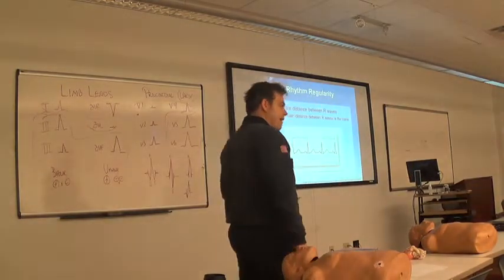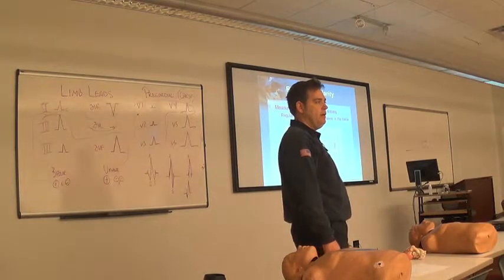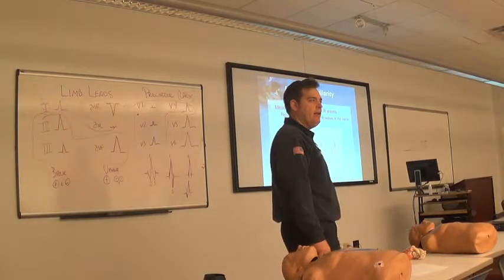When you're looking at a cardiac monitor, how do you know that the rhythm is regular? You can print it off. No, you can tell. How can you tell if it's regular?